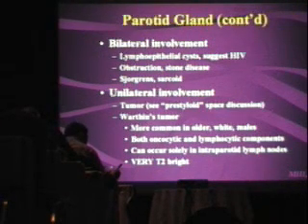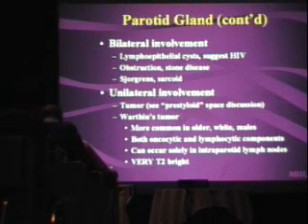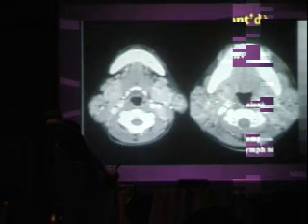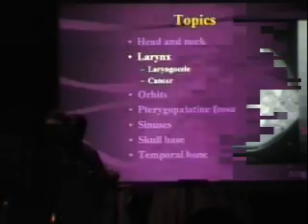Okay? What if you have bilateral diffuse parotid gland involvement? Well, then you can think about microcysts, maybe lymphoepithelial cysts. Who gets those? HIV positive patients. They could be of varying sizes, or then you get to your whole category of Sjogren's syndrome, all these connective tissue diseases that you can see with rheumatoid arthritis, and SLE, and other collagen vascular disorders, Mikulicz syndrome, etc. So this is actually an HIV positive patient that not only of the parotids, but of all the other salivary glands, the submandibular glands as well, have these bilateral lesions.